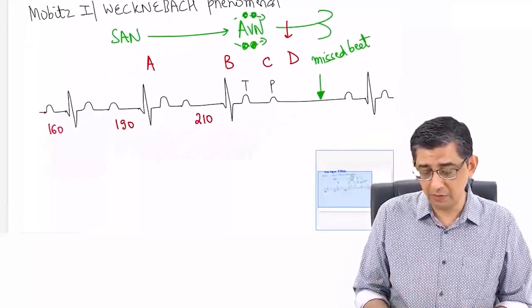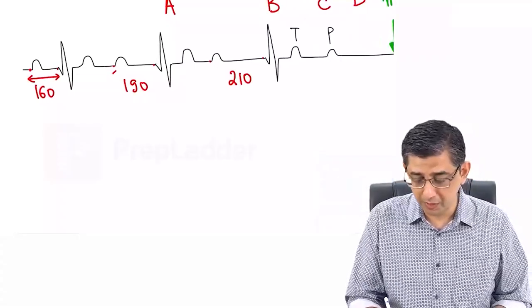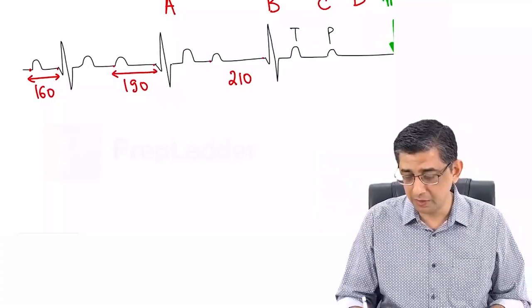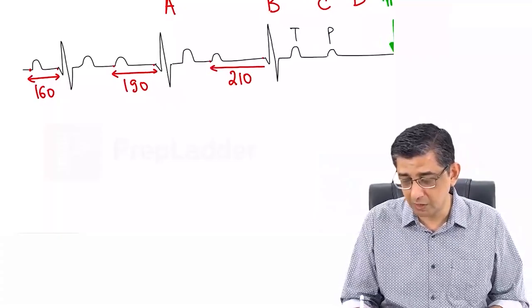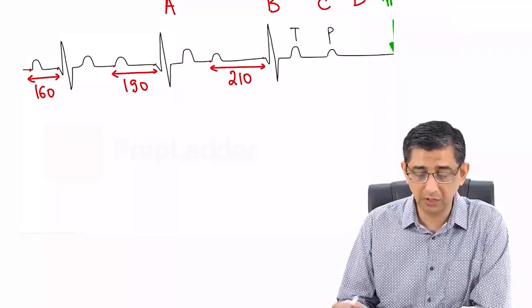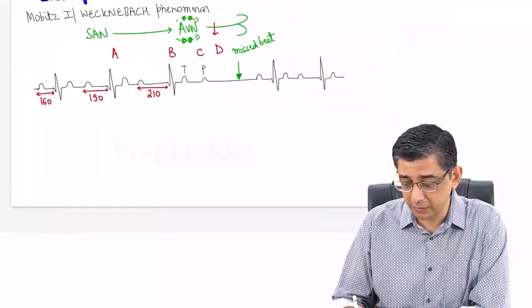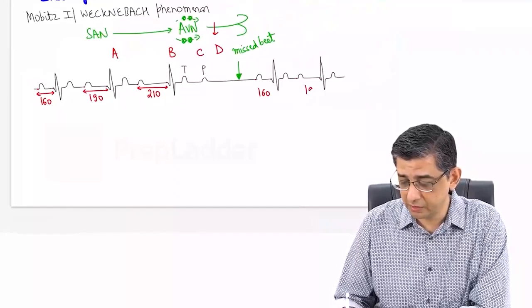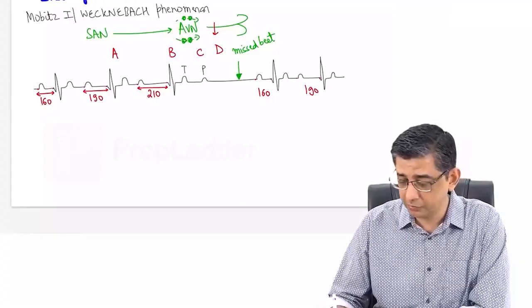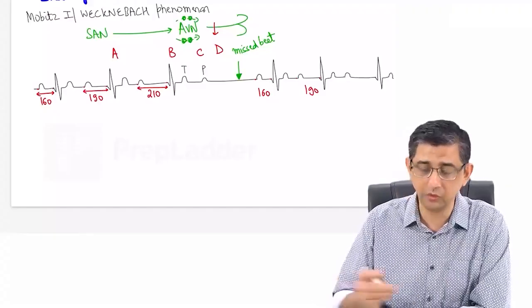And let's zoom it in for your convenience. You definitely can notice the number of squares between the P wave and the starting of the Q wave. Remember, PR interval is not up to the R wave, it is the starting of the Q wave. The PR interval is definitely showing an increment. And then this pattern is again getting replicated. You again can see 160, it will again become 190, and the subsequent one I can also draw before you, saying that now it would be 210 milliseconds, and this is going to go on and on.